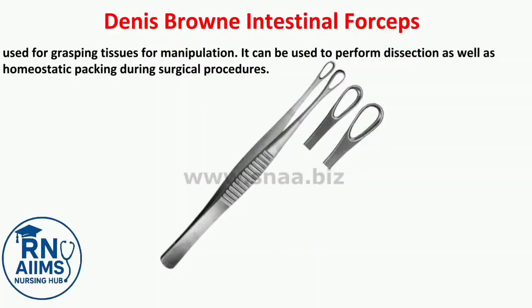Dennis Brown intestinal forceps used for grasping tissues for manipulation. It can be used to perform dissection as well as hemostatic packing during surgical procedures.